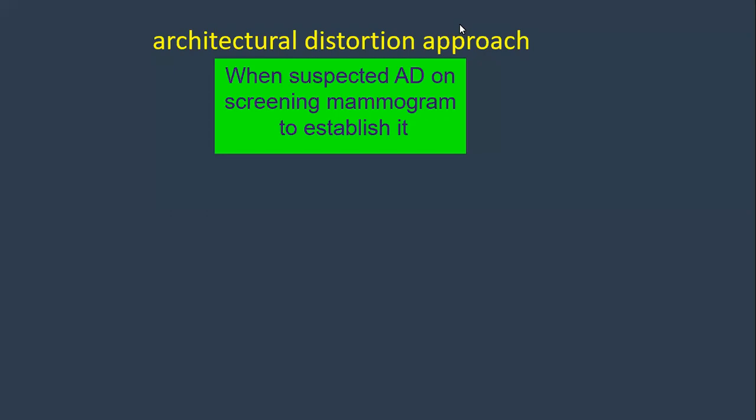You look for the previous images. You change your mind and don't want to bring the patient back to do these other views. Yes, it's one of the options also. You will review the previous images. Excellent. Well, what else?